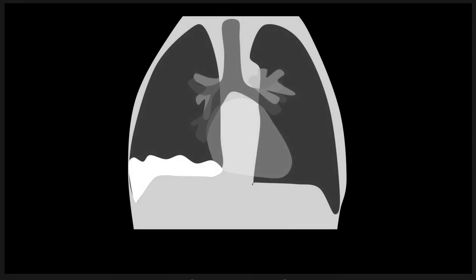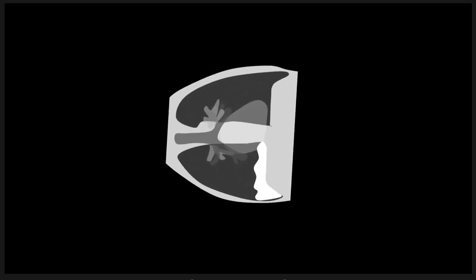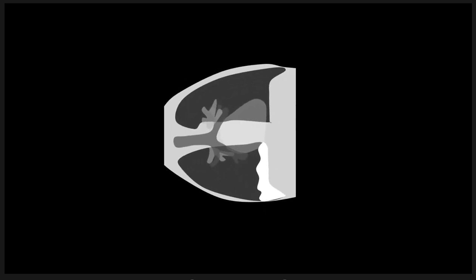Another frequent puzzle is if you've got a patient, these are usually patients that are very ill, ICU type patients, that have shadowing at the lung base, and you're thinking, is this consolidation? Is it consolidation plus a pleural fluid? I'm not sure. Again, you can turn them on their side like that, take a picture in that decubitus view, and if you see the effusion layer off to the side, you'll know that there was an effusion there at the lung base.